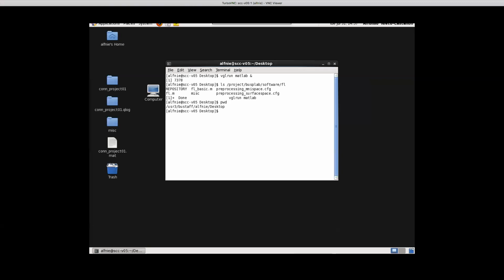In the sphere, you would like to have a relatively uniform representation of triangles. So every triangle is relatively the same, so that when you smooth, you actually smooth in similar amounts across the entire brain. And you also would like to have the same number of vertices across the entire brain, so that you can compare one subject to another, because you want to talk about the surface of a subject and compare it to the surface of another subject.